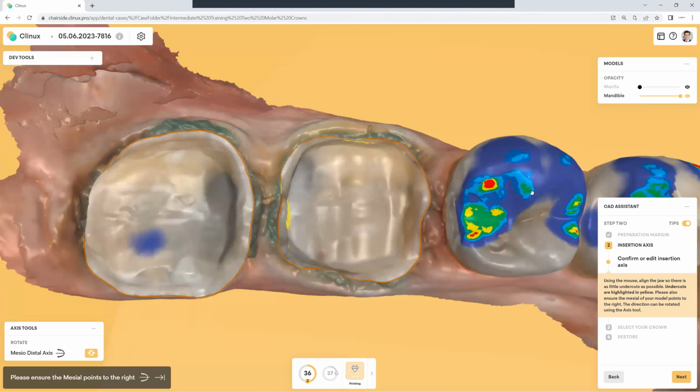And what we see now is, let's say, the initial crown proposal, or positioning, I should say. It's not a proposal yet. It's not attached to the margin. It's the initial positioning of the crown. Needs work, doesn't it? Let's go ahead and do that.